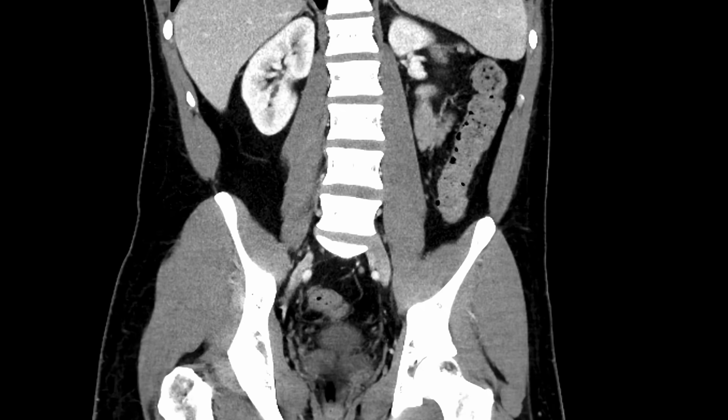Okay, so that's it for this particular talk, looking at mainly anatomy and what normal should look like, as well as a detailed approach to the abdomen and pelvic CT. In the future videos, we're going to look at abnormal cases and specifically talk about things that you should never miss on an abdominal pelvic CT when you're looking at each of the organs.